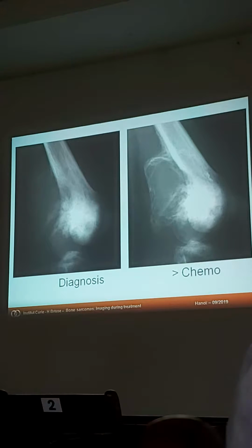Vậy có câu hỏi ra là vậy với cái hình ảnh như thế này thì được gọi là đáp ứng tốt hay là không thì cũng không thể nói được đấy là đáp ứng tốt hay là bệnh đang tiến triển, bởi vì bản thân cái osteosarcoma nó luôn luôn có cái phản ứng tức là phản ứng tạo xương, phản ứng vôi hóa tự thân của cái khối u, và khi mà điều trị hóa chất thì cái vôi hóa tạo xương này nó sẽ tăng lên. So sánh với hình ảnh trước và sau điều trị chúng ta thấy rằng cái khối phần mềm ở cái phim trước này nó to hơn và kích thước của cái vùng vôi hóa phần mềm này thì nó giảm đi, tức là kích thước khối u có giảm. Tuy nhiên thì không thể nói được đây là tiến triển hay là đáp ứng tốt, mà chỉ nói là đây là phản ứng, khối u có phản ứng với đáp ứng với điều trị hóa chất, có đáp ứng.